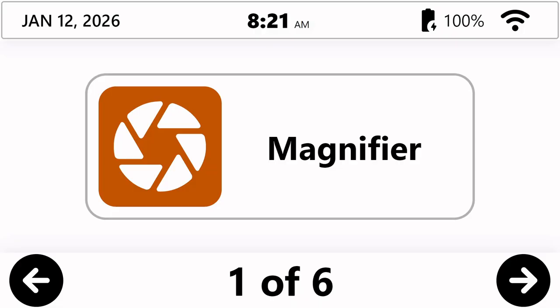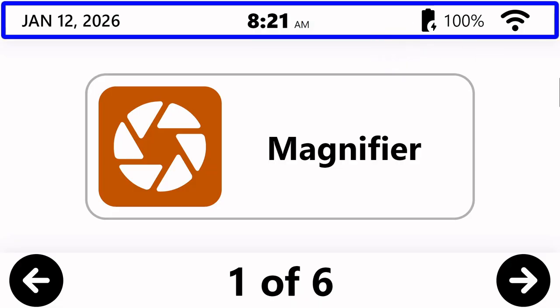In this video, I'm going to review for you the system settings that are available to you through Prodigi. As you can see, I'm currently logged into Prodigi on the screen here, and my blue locator is in the header bar. Now, I can navigate using touchscreen if I'm using a tablet. I am on a PC today, so I have a keyboard and a mouse, but I can also navigate using my keyboard and shortcuts like that.